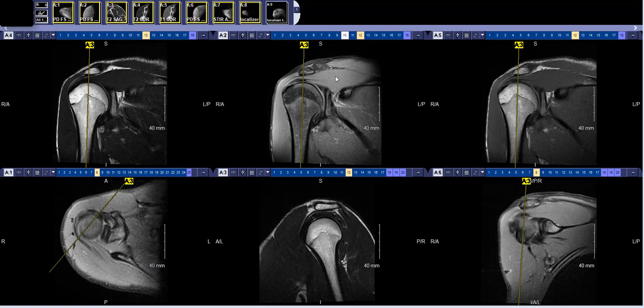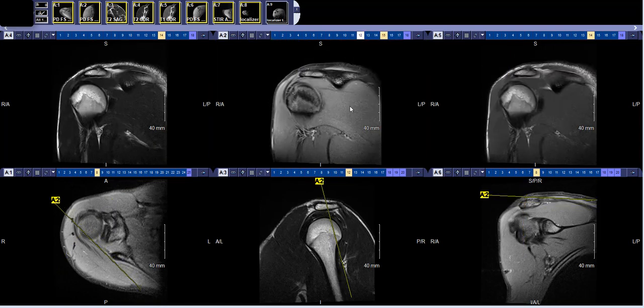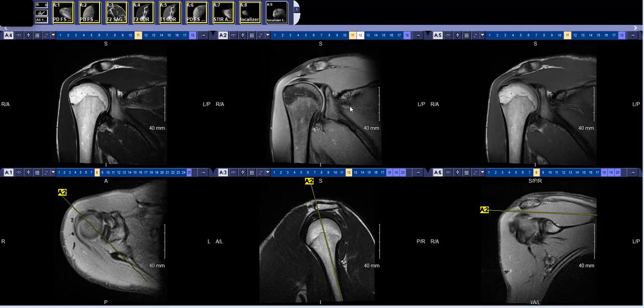I'm going to be reviewing imaging of the upper extremity with MRI, specifically the shoulder, elbow, and wrist. The first study I have pulled down today is our routine protocol for shoulder MRI without contrast. This is a fairly normal study for us to review a search pattern for.